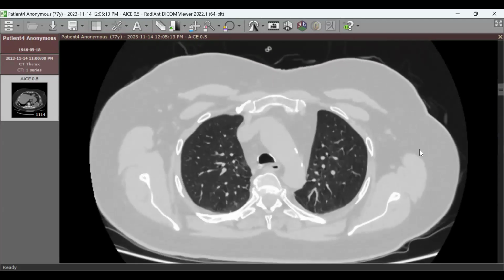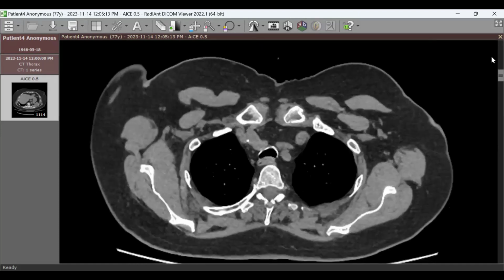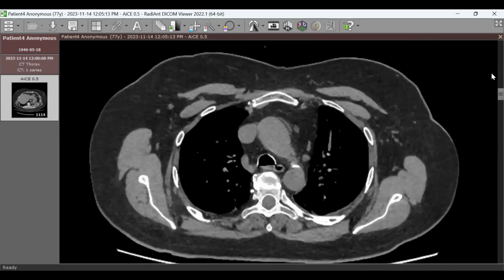So there are rib fractures. Is it important if the rib is broken on 2 points? Yes, it is, if more than 3 ribs are broken on more than 2 points. So we have suspicion of flail chest. So it is a major trauma to the chest.